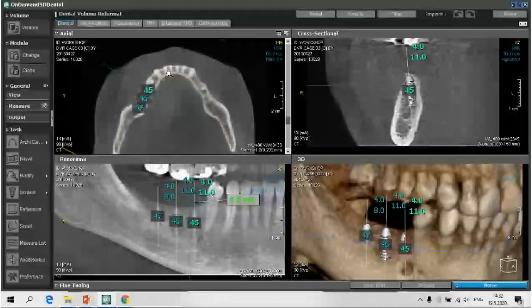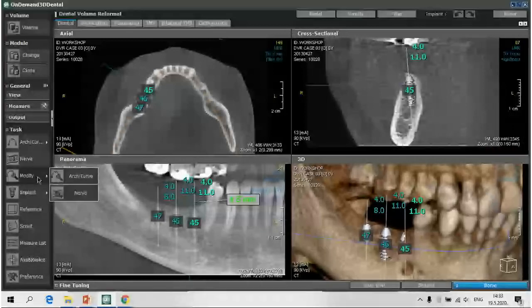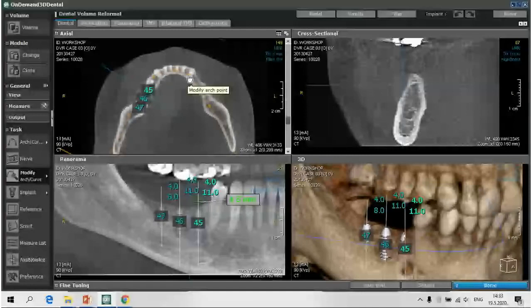The shape should be followed in general, because if we have too many curves drawn while we are marking the arch, then we could have mistakes and wrong orientations on the cross-sectional pictures in the right angles. So I will just show what I'm talking about.